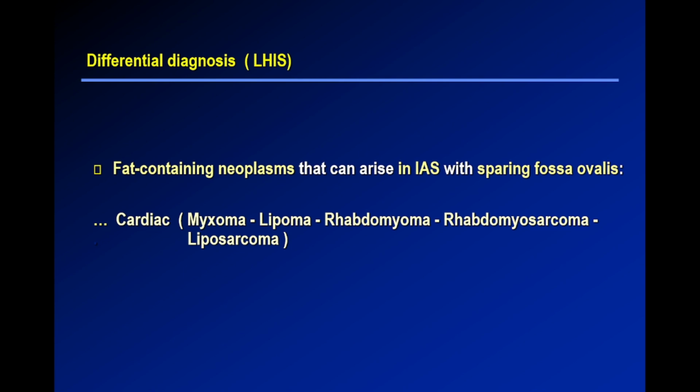For differential diagnosis, we have to consider all the fat-containing neoplasms arising in the interatrial septum, including cardiac myxoma, lipoma, rhabdomyoma, or others.